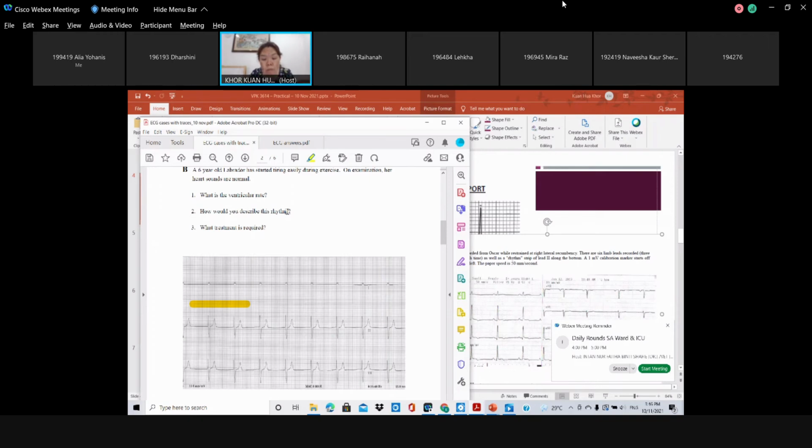Doctor, is it 60? How many ventricular, how many R are you getting here? 2 only, right? If I just highlight here 15 boxes, it's only 2, not quite 3. So 2 times 20, 40. When you talk about ventricular rate, you're actually referring to the R of the QRS. So it's only 40. So the ventricular rate is 40.